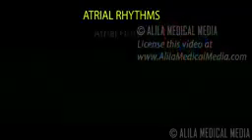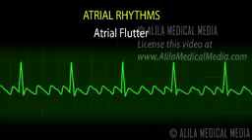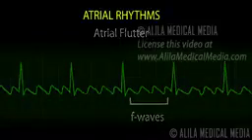On an ECG, atrial flutter is characterized by absence of normal P wave. Instead, flutter waves, or F waves, are present in sawtooth patterns.